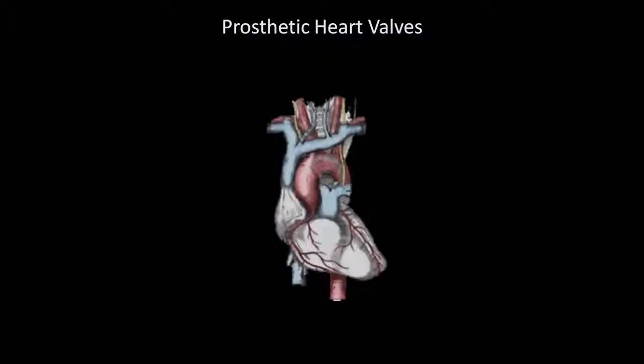One last method to identifying the location of prosthetic valves is to imagine the frontal cardiac silhouette vertically bisected along the midline. The valve that is crossed by the bisection line is the aortic valve. If one then imagines a horizontal bisection, such that there are now 4 quadrants, the pulmonic valve is up and to the patient's left from the aortic, the mitral is down and to the left, and the tricuspid is down and to the right.